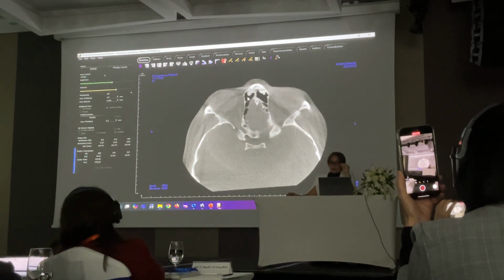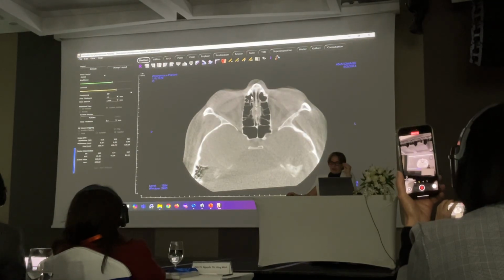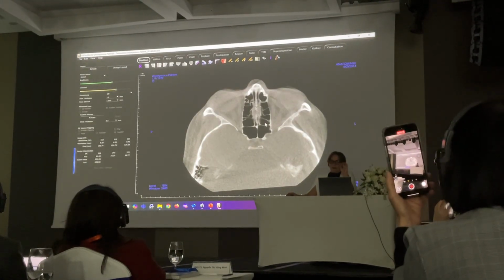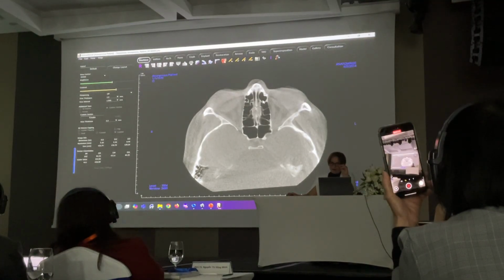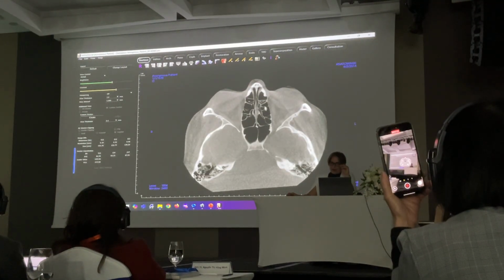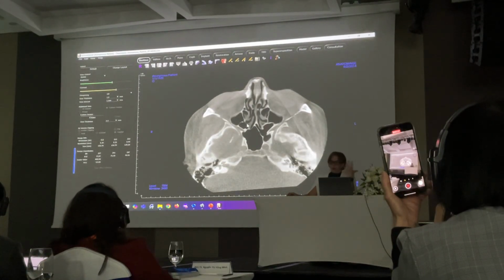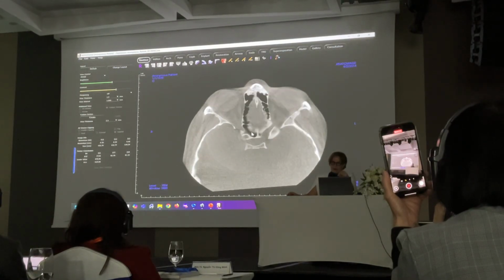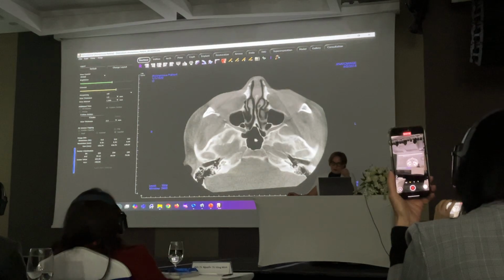Going down through now, two sets of air-filled spaces. Here we have the ethmoid sinuses, and here we have the sphenoid sinuses. Same thing, black on white, black on white. We go through this set of air-filled spaces first, the ethmoids, and of course it's a whole bunch of air bubbles. And then we're going to go to the top of the sphenoids. Starting from the top, moving our way down, black on white is what we want, all the way down.